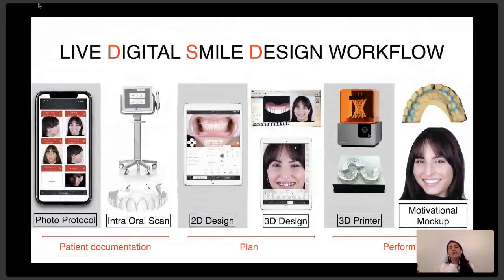It is a patient documentation storage, gathering all of your information and putting it in one place, all together and organized. That makes a world of difference for me, because you don't have to be uploading it, downloading it, sending everything. All of the communication can be done through the app. So it's going to be life-changing only because of that. So the app is so much more than just a smile simulation, like I was saying.